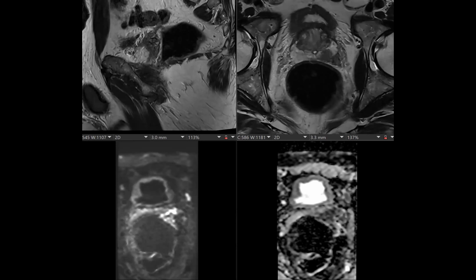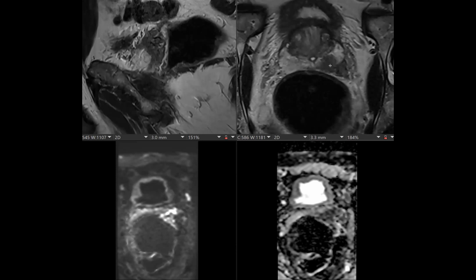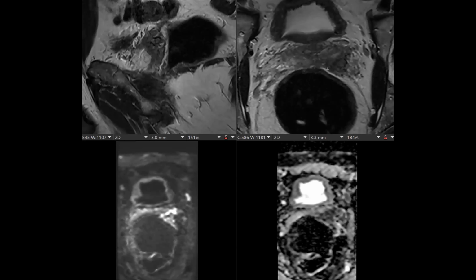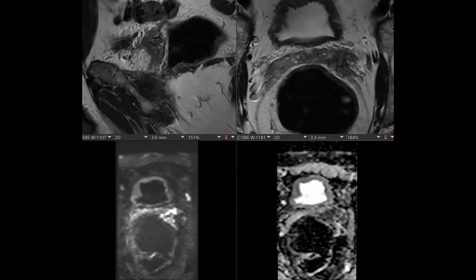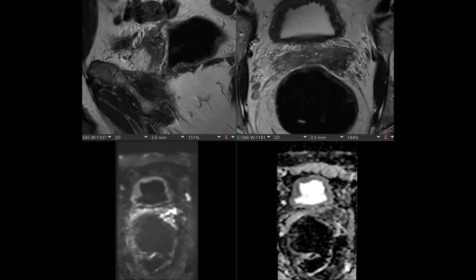This is a patient with a pretty big prostate tumor here on the left base. So the question here is about SVI. I would definitely give this grade 3 in terms of EPE, right? We see tumor, there's your EPE right here, tumor outside the prostate margin, going up. And the SVs are here. Here's one on the right and then the left. So the SVs are there.